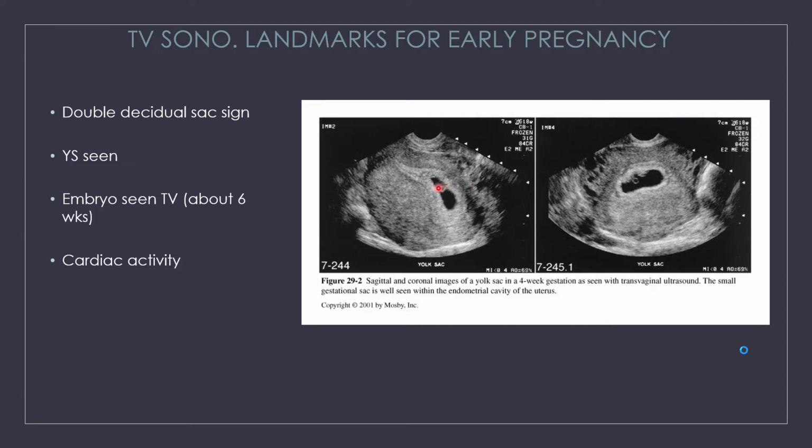So this would indicate a normal IUP, intrauterine pregnancy, okay, because it's in the uterus, it's in the fundal portion of the uterus. And you're probably thinking, how do you know it's the fundus? It doesn't look like that last one we saw. Well, this is an endovaginal scan, okay? So it's going to be a different sort of orientation. It's just going to take some getting used to scanning, okay? And then this is a transverse image. We can see an ovary over here, some over here, but honestly, this may also be some of the uterine vasculature.